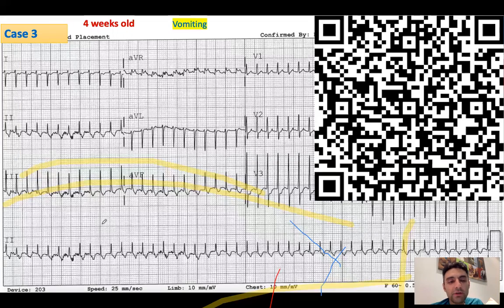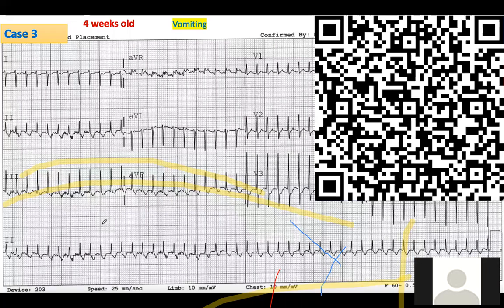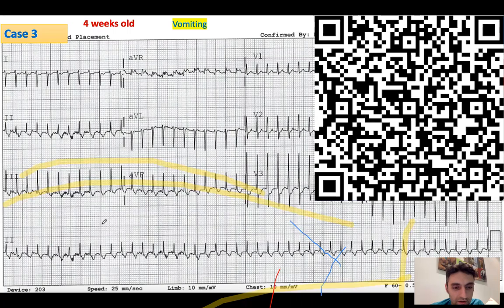Okay, point. Can you point, by the way, or you cannot? Can you try to point? Where are the key waves that you're looking at? Okay. Here. Where? Okay, good. So you see it all the time?